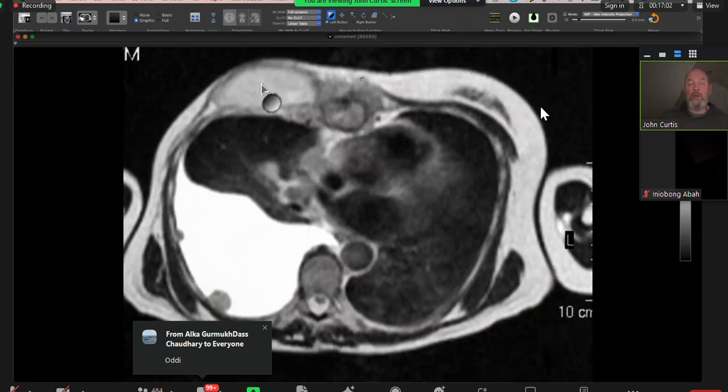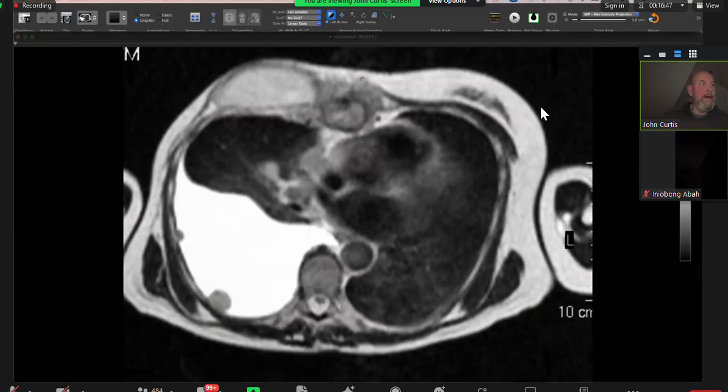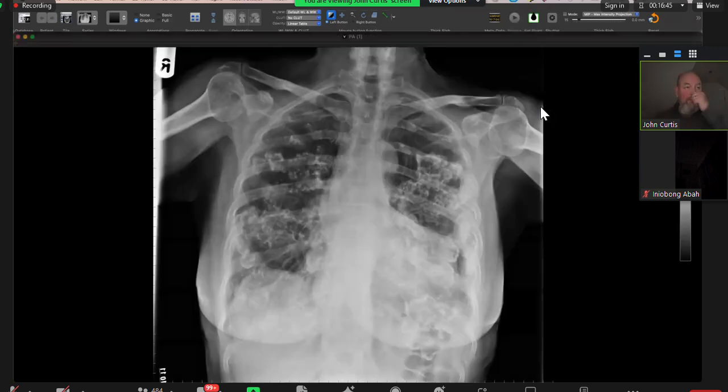Breast prosthesis on the right side indicates breast cancer. We've got a sternal deposit, and we've got a large pleural effusion with 2 pleural deposits. So it's breast cancer with bony and pleural metastases. If you've never seen this before, just lock it away in your memory banks, smash it in the exam.